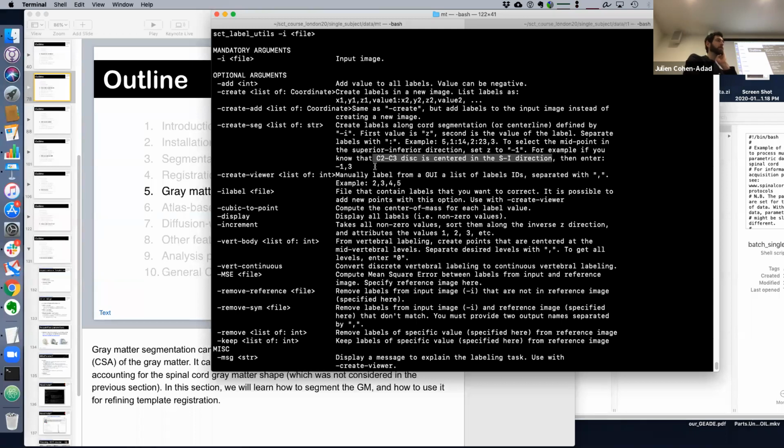If it still does not work, let me know, and then we can add a patch to SCT so that it will not convert to a floating point of 64. Currently we are changing the quantization of the input image to a very large number, and that blows the RAM. So we can change that to accommodate other configurations. So let me know.